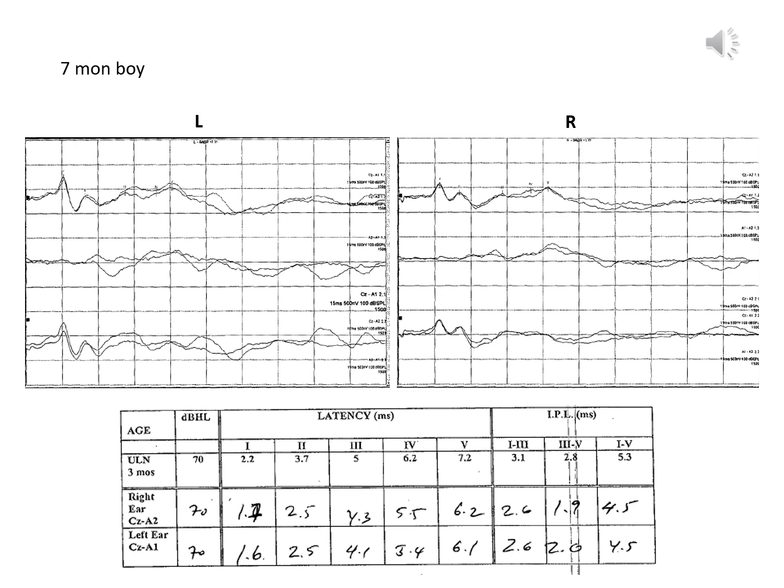And so in this case, we have selected the 1, 3, 5 in the left ear and a 1, 2, 3, 4, 5 in the right ear. And the numbers are placed in the chart at the bottom. And you'll just notice that the chart at the bottom is upper limits of normal from 3 months on up. And so this is a 7-month-old boy, and so this is appropriate for this age. And so just scanning across the numbers, they look normal. They're below the numbers that are typed, and so this is a normal study in this 7-month-old boy.